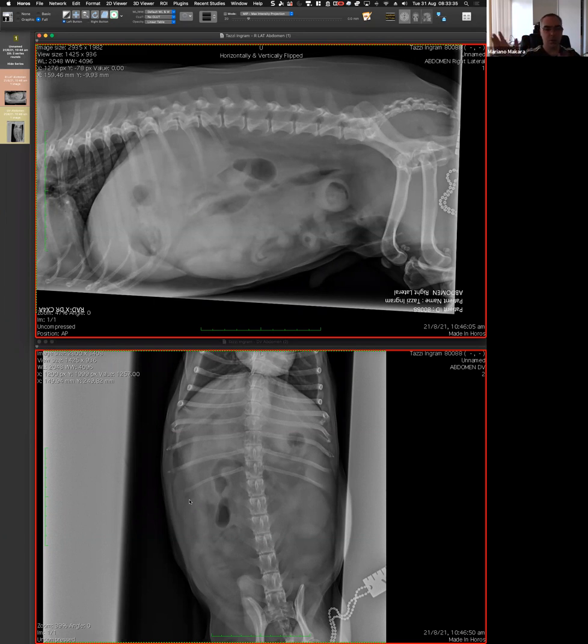Do you remember that we said we have these two populations of bowel, there are exceptions to the rule? The ideal situation is when you have something obstructed in the middle, whatever is oral to that gets distended, whatever is aboral to that is normal or empty. And we say, well, be aware that there may be the situation where there is something very oral and makes it very close to the stomach. And the hallmark of that situation will be a pyloric obstruction.